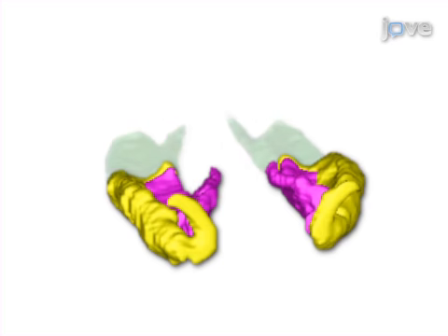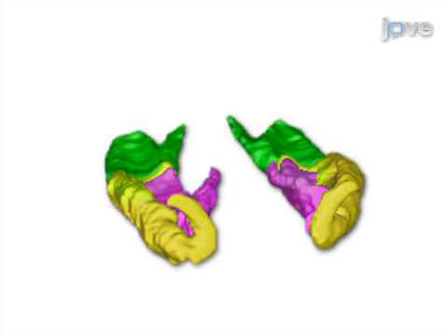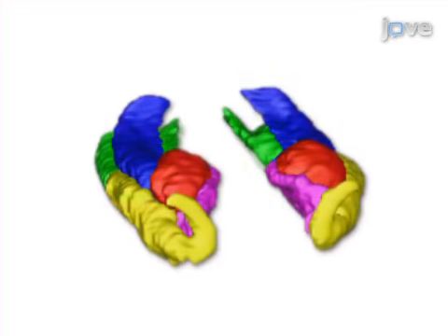The final step is to trace the posterior segment of the parahippocampal gyrus, namely the parahippocampal cortex proper, in the same anterior-posterior fashion. Ultimately, this manual tracing procedure can be used to obtain a 3D rendering and volumetric statistics of all medial temporal lobe structures.